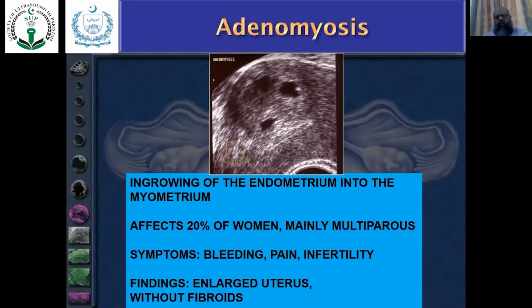So even one side of the uterus myometrium will be increased. So if you get a patient with one of the walls seem to be hypertrophied, better to call her back during menstruation. So you will get these spots and the diagnosis will be confirmed.